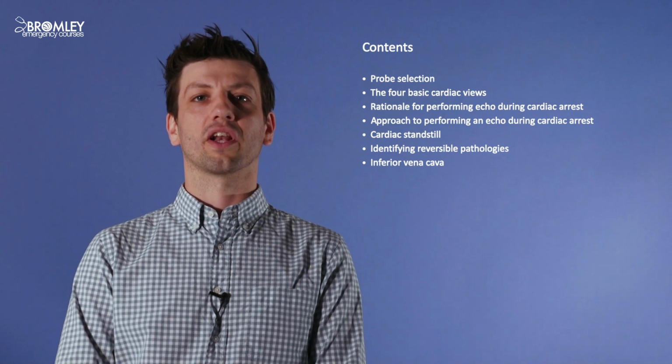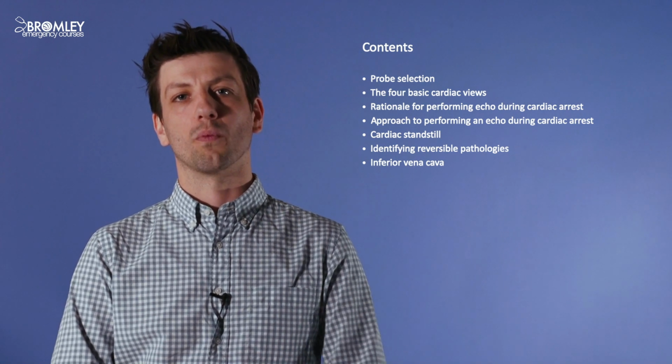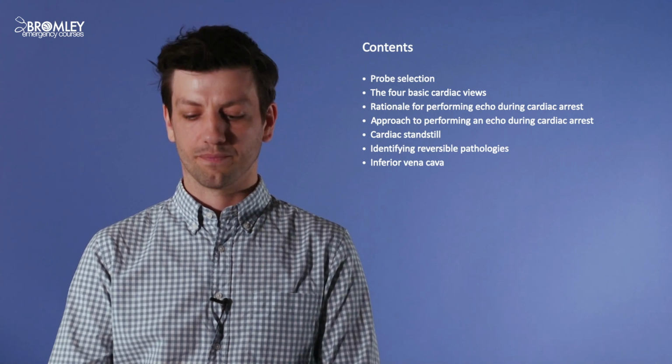We'll finish off by talking a little bit about the inferior vena cava, how we image that, and what we can interpret from those images.